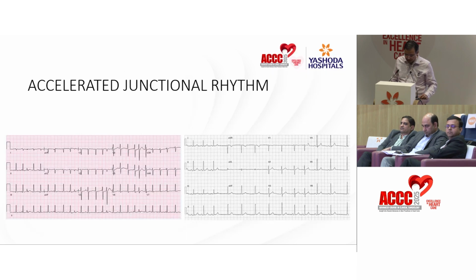Sometimes we have this ectopic junctional rhythm, where the junction is able to capture, sometimes it is not able to. Sometimes the P wave from the native node is able to conduct, so you will have a variable appearance. So this is a case where you can see the first three are sinus conducted beats, then these are junctional beats. Here you have a funny looking ECG.